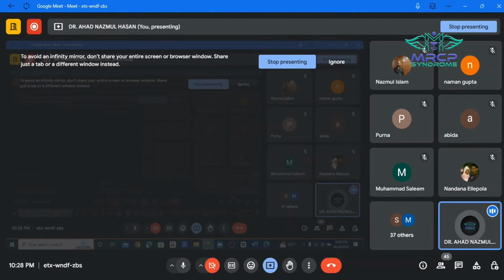So the gadolinium would be very bright on T1 weighted image, and gadolinium enhances the images that are especially useful in looking at the vascular structures and breakdown of the blood-brain barrier, like the tumors, abscess, inflammation, especially the herpes simplex encephalitis as well as the multiple sclerosis. So in case of herpes simplex encephalitis and multiple sclerosis, we usually go with the MRI with gadolinium contrast, and in that case we use the T1 weighted imaging.